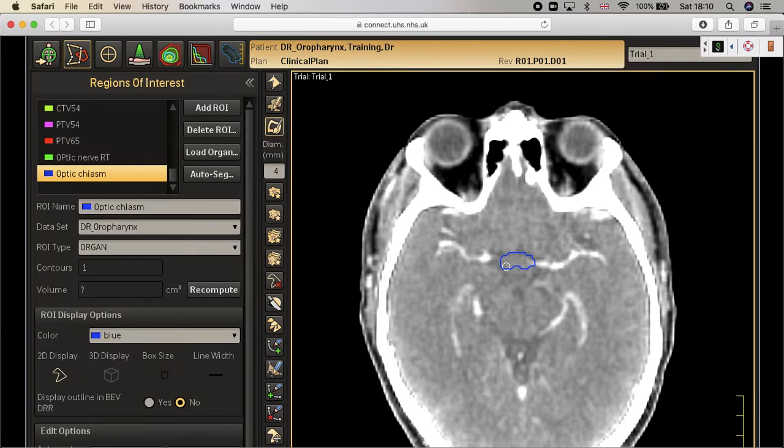And if you did it something like that, like for this guy, I would say it's thick, so I wouldn't do that. But if you are worried and you want to do it, I wouldn't care if you take the PRV, and that's it. All you have to do now is to understand the anatomy, how the anatomy will look. So if you put the cursor on the body and you move your arrow down, so we are going to the next slice, which is downward.